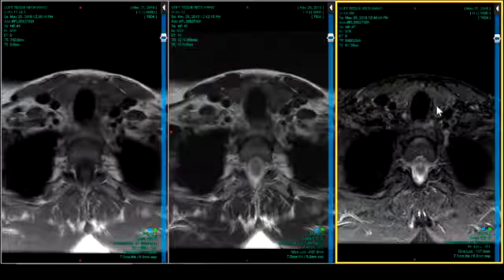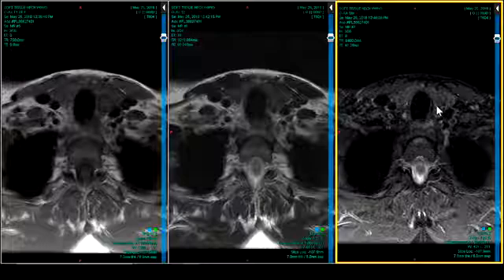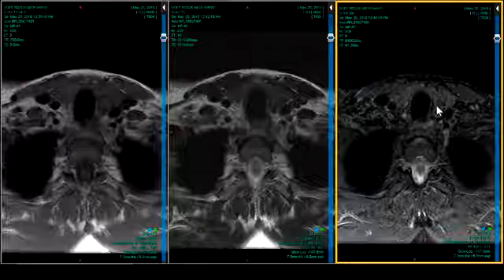But this is a case, although we don't have the genetics, most likely of multiple endocrine adenomatosis, with most likely medullary carcinoma of the thyroid, but with a glomus vagale and a chemodectoma on the right, separating the carotid arteries, and with an elevated calcitonin level, and the imaging is not over. That thyroid thing is tricky, isn't it? If you don't think of the syndrome and go after the thyroid, you are never going to see that lesion. And it's really important because that's a malignant lesion.